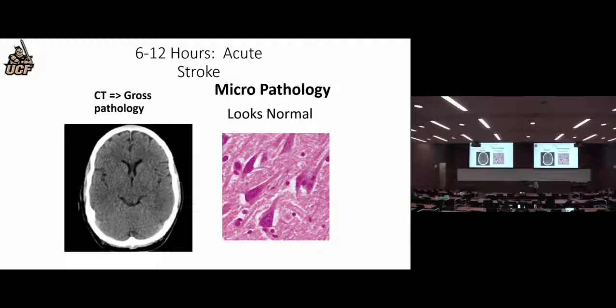That's why the main thing you're looking at is the clinical findings that alert you to the fact that it's probably a stroke, and then the absence of blood, and that gives you a lot of information right there. Now, if you look real closely, I think you can say the sulcal markings are a little better here than they are here. They're a little bigger. Maybe this density is a little bit less here than here. It's really subtle. If I had to say which side the stroke was on, I think I would say it was here.